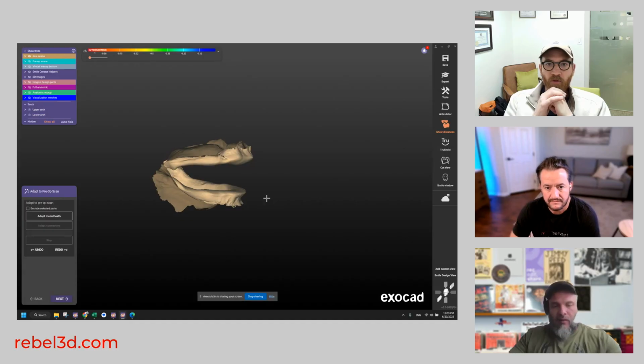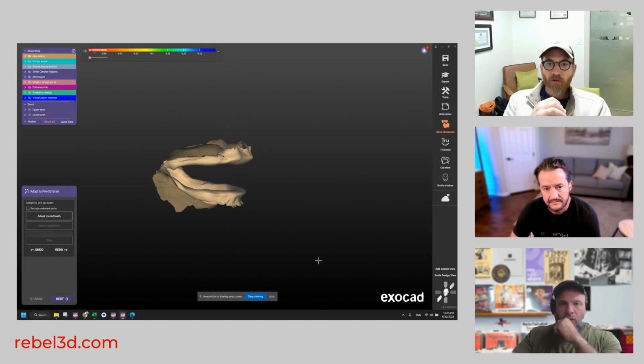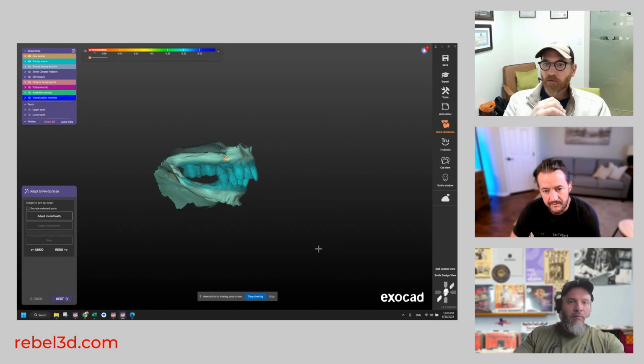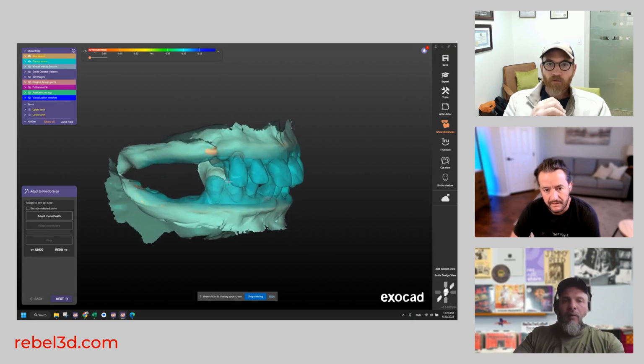So we're both sharing the same exact case, and Dr. Sven will show you the aftermath of all this. But this case has just had, let's call it a digital bone reduction, not based on any objective data.